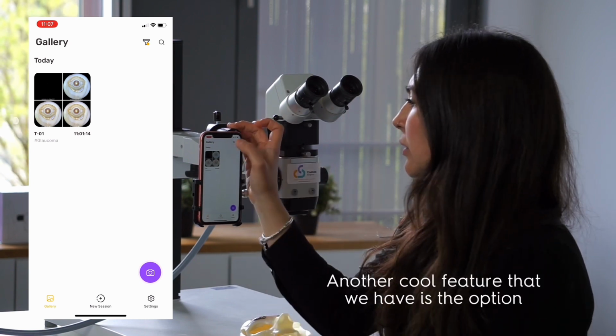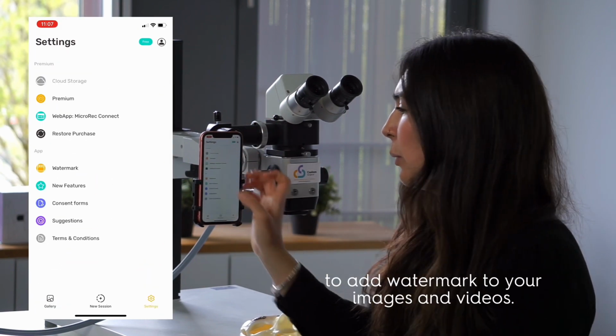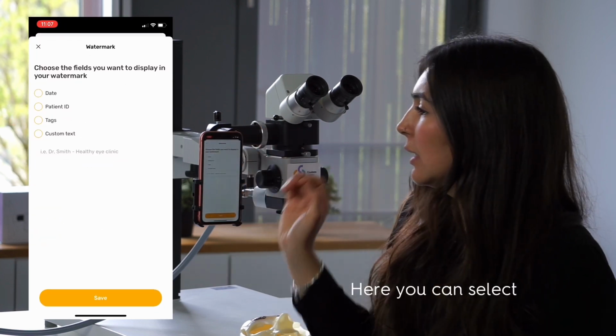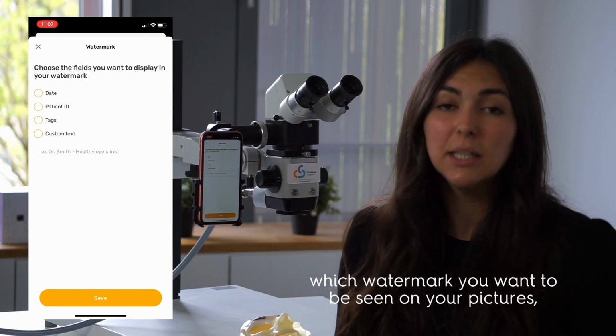Another cool feature that we have is the option to add a watermark to your images and videos. So here you can select which watermark you want to be seen on your pictures.